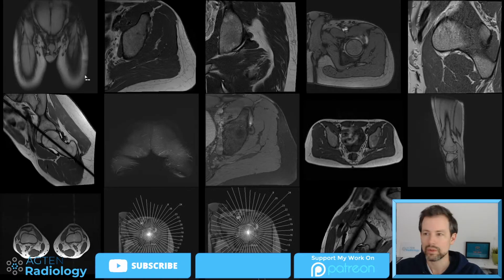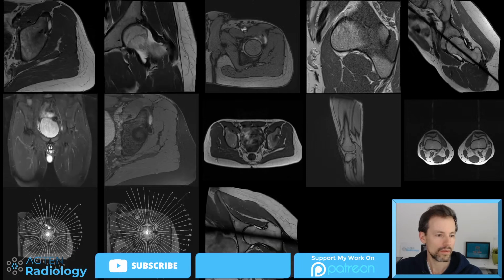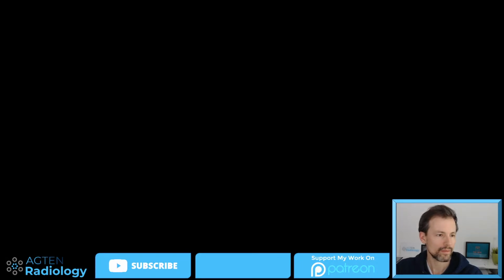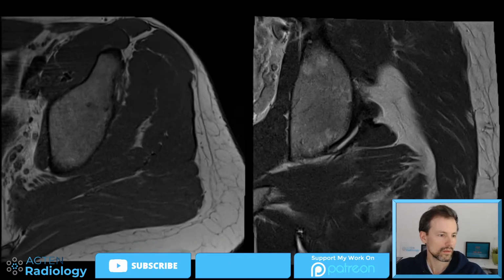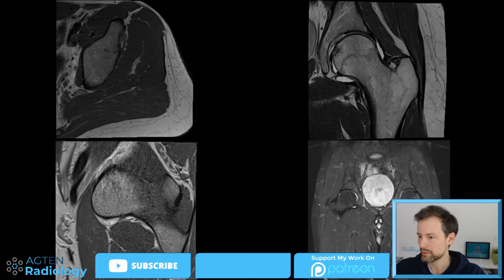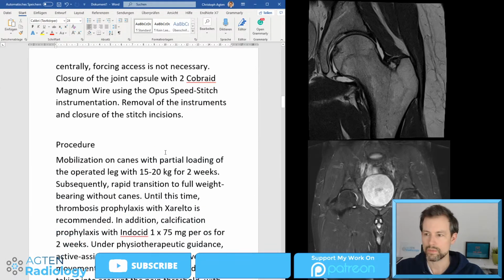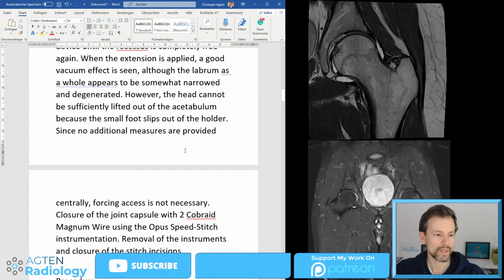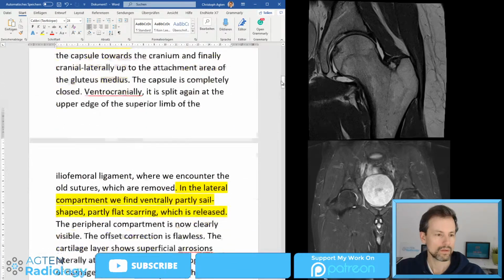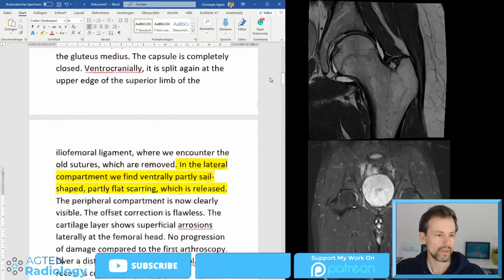So we got this one here. You can see the image. That's fine. And now let's see what's going on here. Just quickly loading up some images here and showing you the translation as well. And this time I have to overlay on my screen as well, so I will not forget to put it away. Still trying how to do this properly. Okay, case 2, where is case 2?